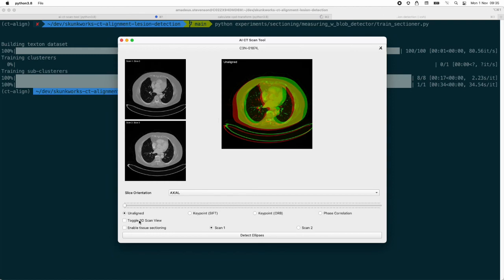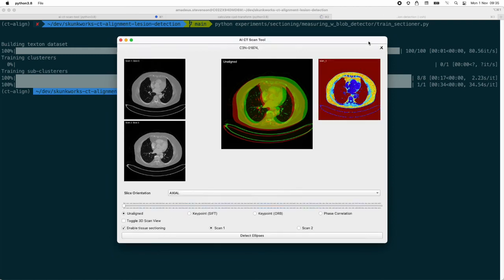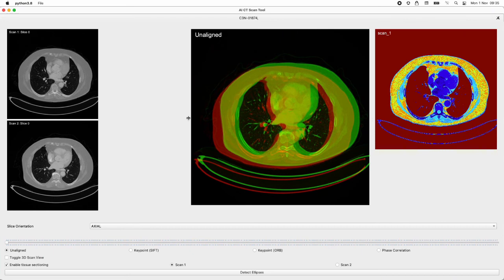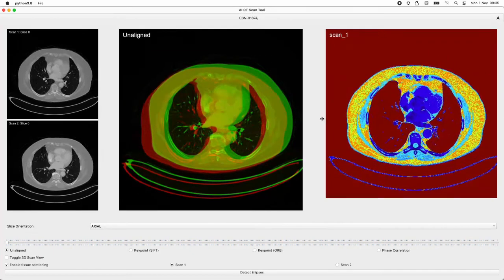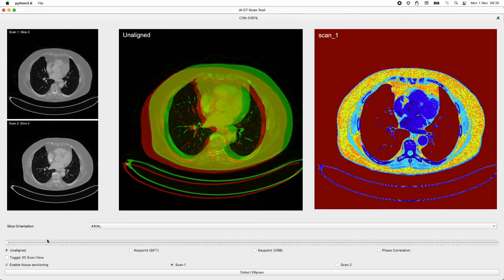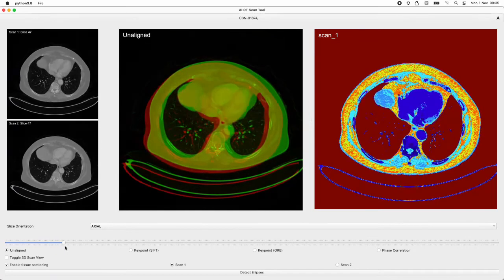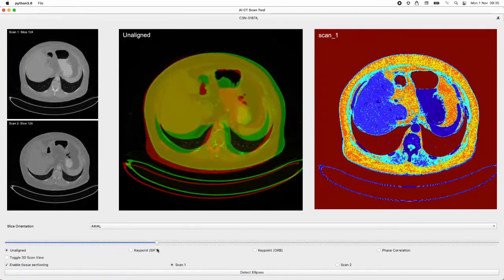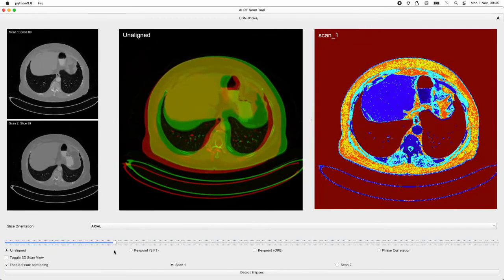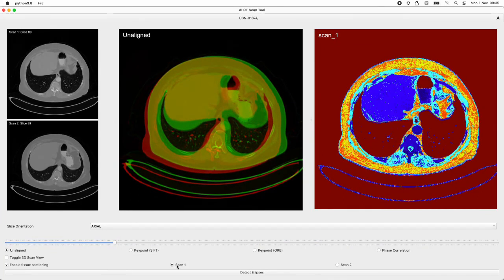and now you will be able to enable tissue sectioning to access the tissue sectioning model. This will be available throughout the slices, and the parameters can be modified in the Python script. You can select which scan to apply the segmentation to.